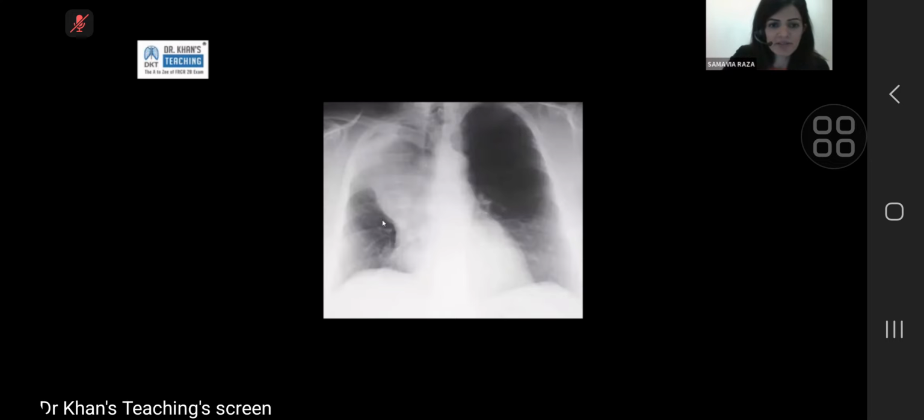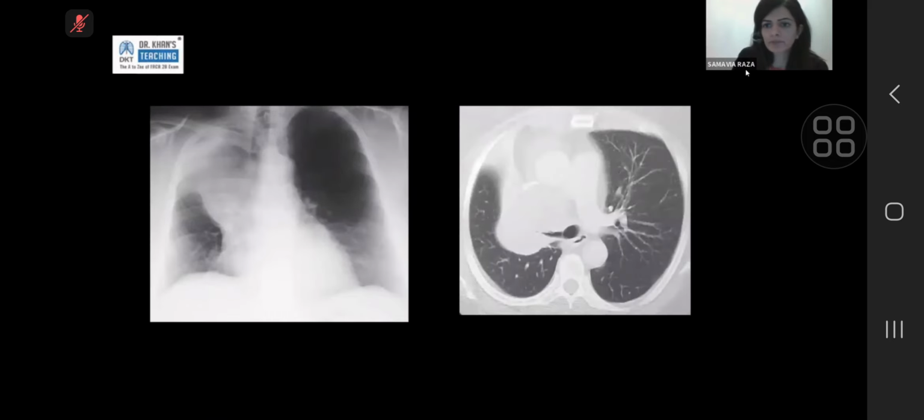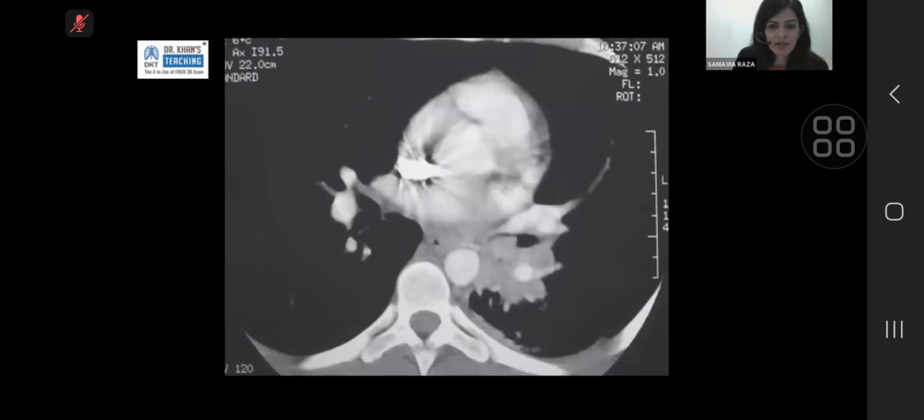Yeah, absolutely. This is the reverse S or the golden S when you have a central tumor, and you can see the bulge here that is causing distal collapse. So yes, well done. Central tumor, distal atelectasis caused by the obstruction.